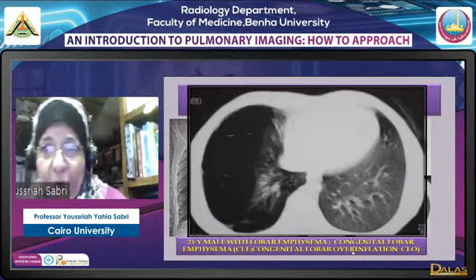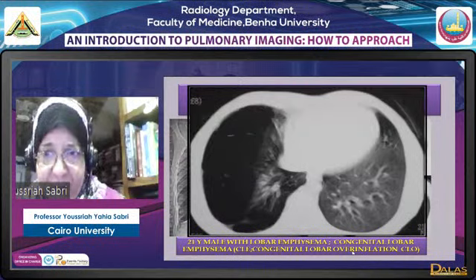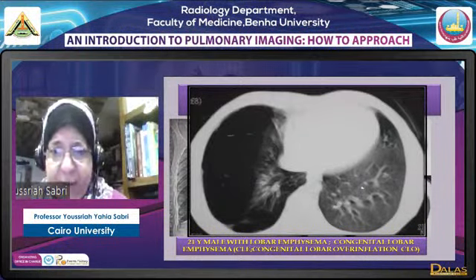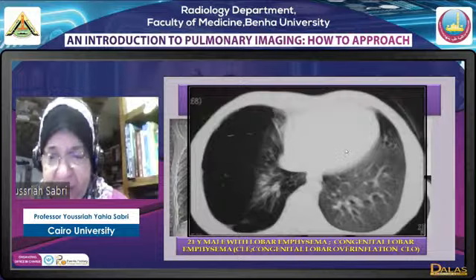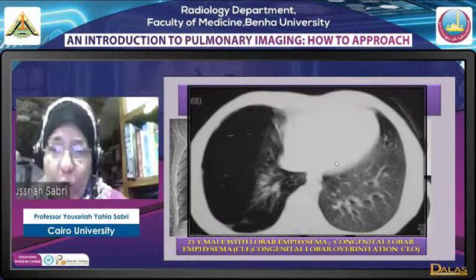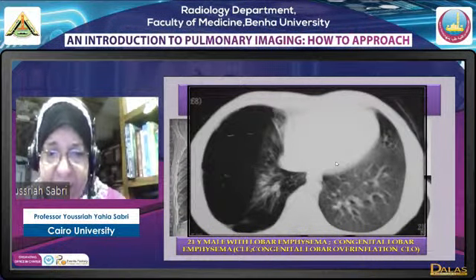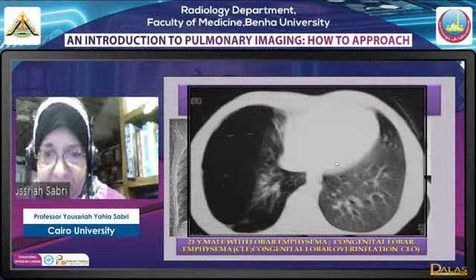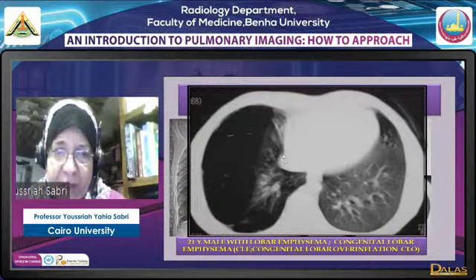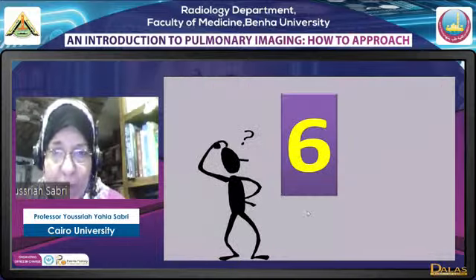Actually, this was the preoperative film of the patient, before the lobe was removed. He came to us later, but I have made a copy of this study. So this is congenital lobar emphysema. We have only one lobe markedly emphysematous, obstructive emphysema. It's a congenital cause. The presence of the other lobes somewhat balances the lesion.